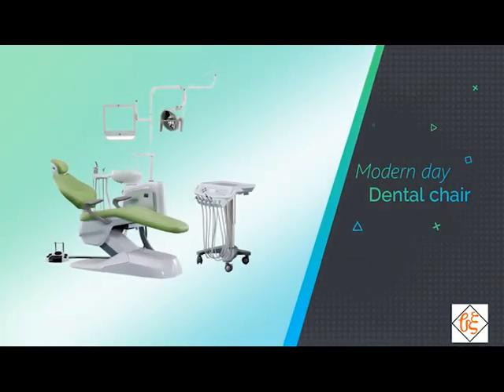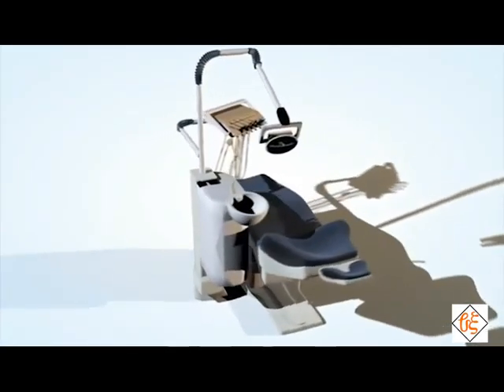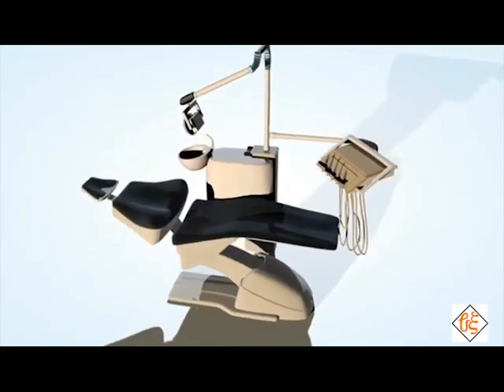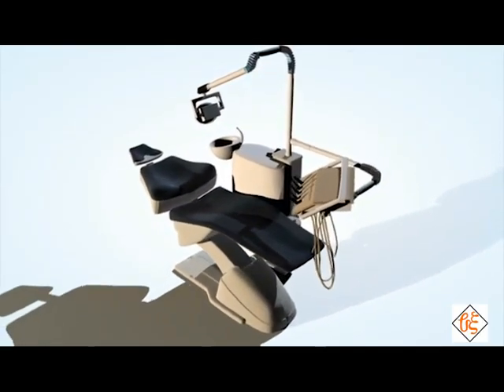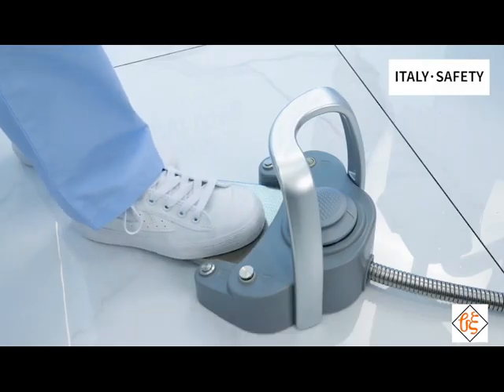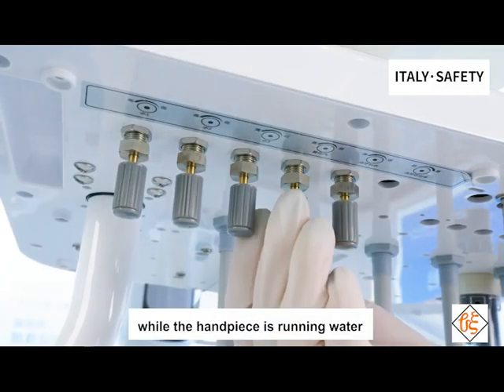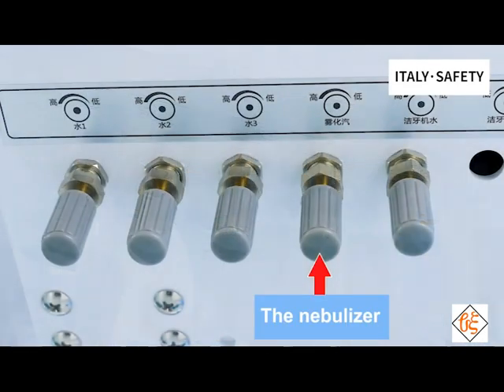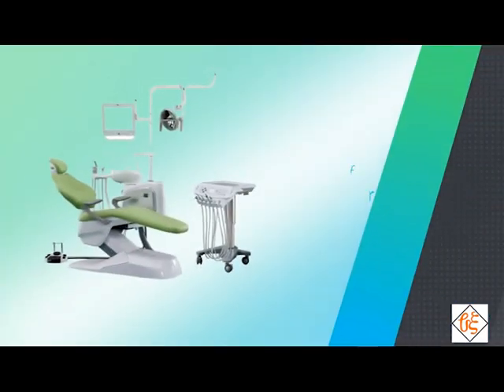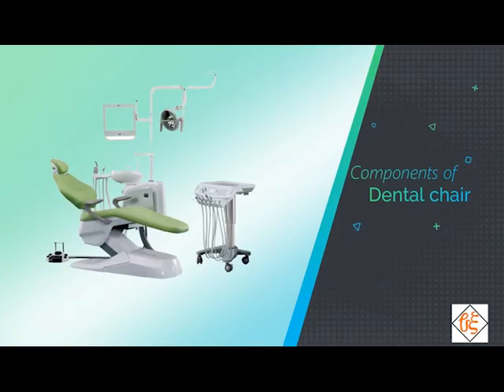Let's look into modern-day dental chair structure. Dental chairs are a major fixture in any dental clinic because they are the center of a dental procedure. Because of this, dental chairs are affixed with various parts and components that will help make any dental procedure smoother and more efficient. In fact, it often seems like there are too many components attached to dental chairs. Let's look into those components of dental chairs.